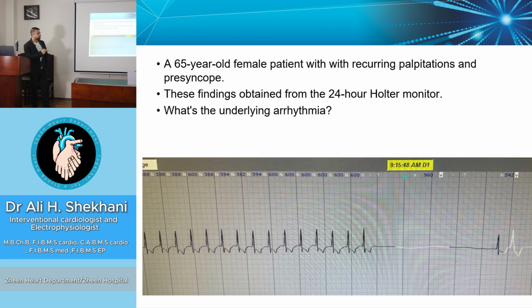This strip is taken from a 65-year-old patient. This is a Holter monitor. You can see here the patient has tachycardia, and suddenly the tachycardia terminates, but there is a very long pause, which is about 5 seconds. So this indicates that the patient has sinus node dysfunction because there is a long sinus recovery time.